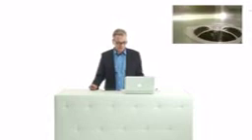Why do we have such a flow convergence zone? The following video will show this to you. This is a sink filled with water, and now we're pulling out the plug of the sink. And you will now notice that water is streaming to the opening, and that the flow of water increases in velocity the closer it gets to the sink. If you know how high the flow of velocity of the water is, then you can actually estimate how much water goes down the sink, and essentially even how large the opening of the sink is.